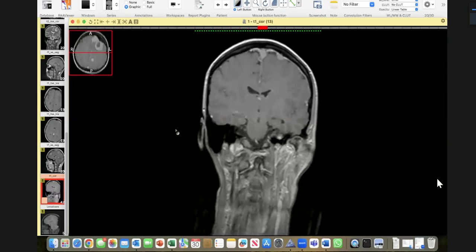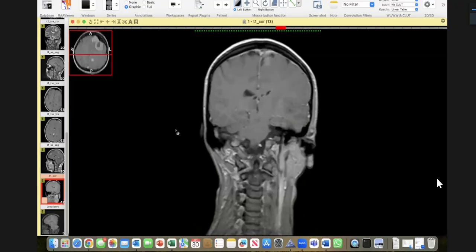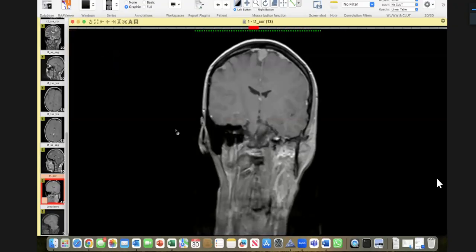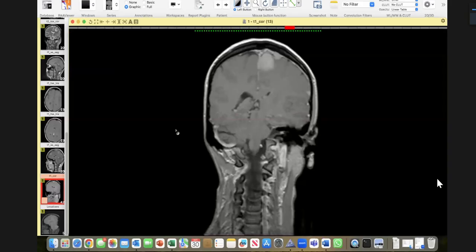Which nerve is this? Sir, internal auditory canals. Do you see anything there? No, sir, no significant enhancement. Okay, thank you.